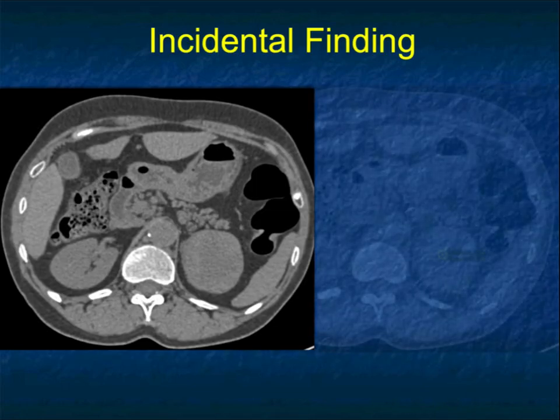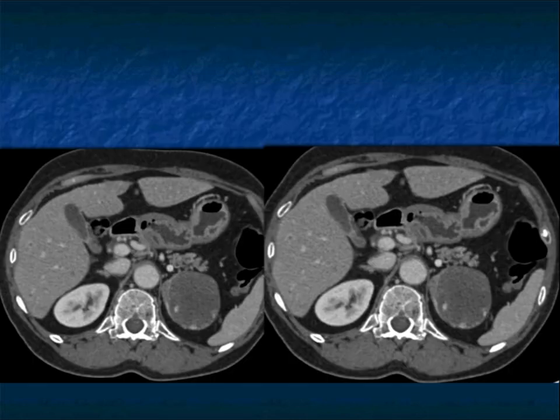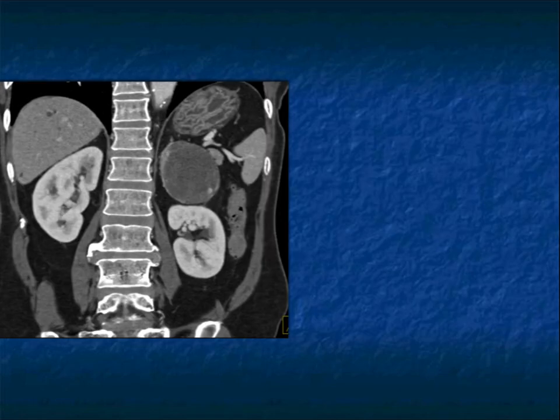Now, other examples. Left adrenal mass, it's solid. The mean is about 29 Hounsfield units. It's interesting when you give contrast, it's somewhat cystic with some peripheral puddling around the edge. And I have to admit, if you thought about this in the liver, you might think about this as a hemangioma because there's peripheral puddling. There's some wall thickening superior medially, which is concerning to me.